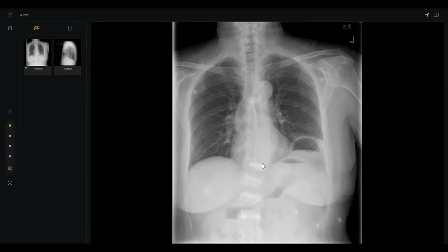In addition, there is no cardiomediastinal shift. Heart is lying in the center. Both the lung parenchyma appear unremarkable. There are important findings that I can appreciate. There are multiple areas of hyperdensities involving the lower dorsal and the upper lumbar spine, which could represent a vertebroplasty, maybe, and there's mild scoliosis of the lumbar spine as well, with convexity towards the left side, right side.